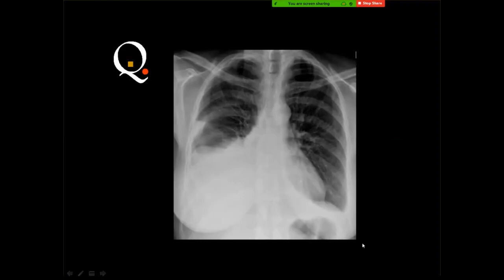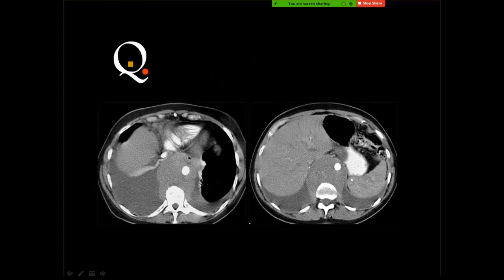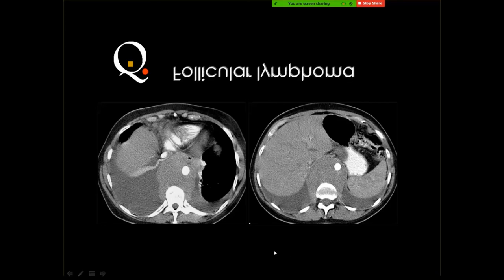Pleural effusion, the right lung. There is a mass outside. Another effusion here, but if you look carefully at the surface of the effusion, it is not the crescent sign. It is associated with the mass. Upward. Then you suspected that there is a mass underneath the effusion, and you got a mass. And this mass is big. It's lymphoma. Yes, non-Hodgkin. The aorta, the floating vessel sign, pleural effusion, and this was proved to be a follicular lymphoma. Very good.